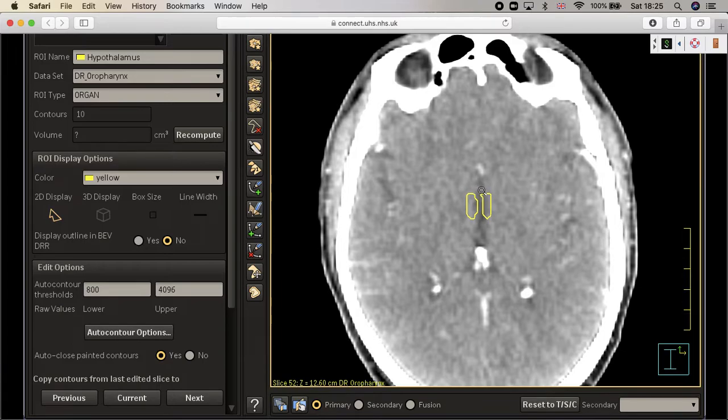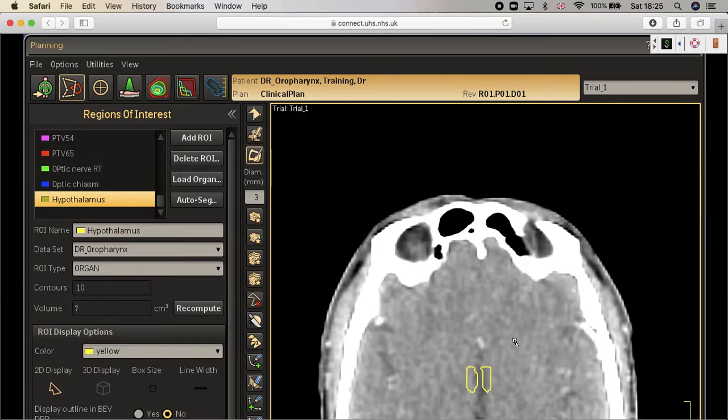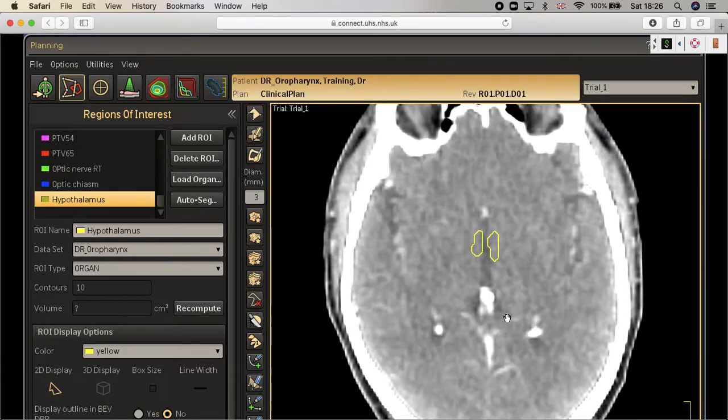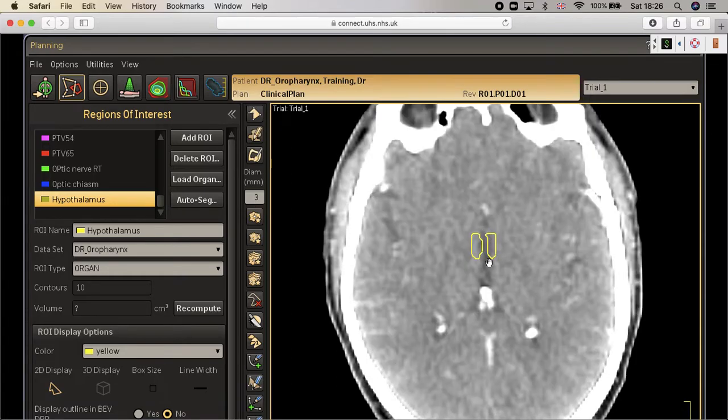So I would say there may be here, maybe this cut as well, and then all you have to do is join the anterior commissure to the posterior commissure. I would say it looks like this. This is the anterior commissure actually, so maybe we have to do that in this slice. Okay, good. Let's see. Trying to localize the anterior commissure with the posterior commissure. Yeah, it seems to be. This looks like the anterior commissure. So the guidelines would say you just have to connect both together. 3 millimeter thickness. Make it homogeneous. This will be your upper last cut on the hypothalamus as a structure.